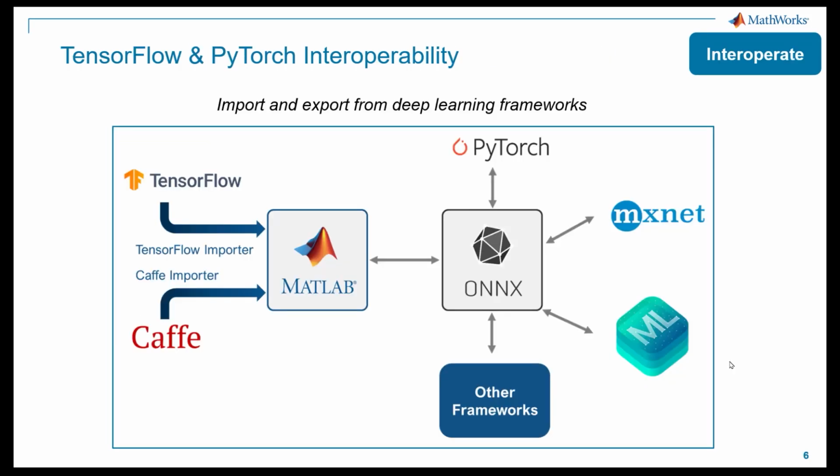Okay, so as I said, a lot of times you can just bring in your data directly, but sometimes, especially if you're working with other people, you might need to interoperate with people using Python-based tools. I just want to give you the sense that if you have to bring in data from outside of MATLAB, that should never be a stopping point for you. We have all kinds of tools for interoperating with third-party tools like Python.